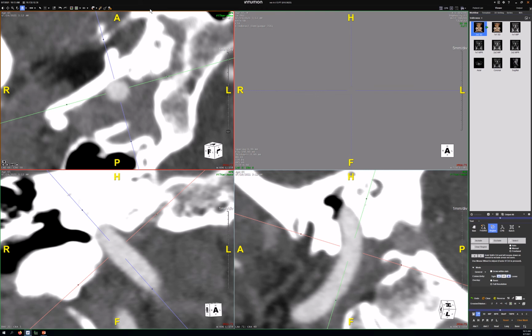People don't realize it. One place the aorta is often oval is between the left carotid and the left subclavian, the isthmus. It's slightly oval where it passes through the diaphragmatic hiatus, and also slightly oval at the aortoiliac bifurcation. So the vessels aren't always perfectly circular in cross-section.